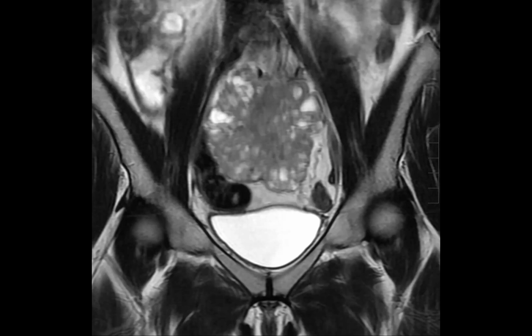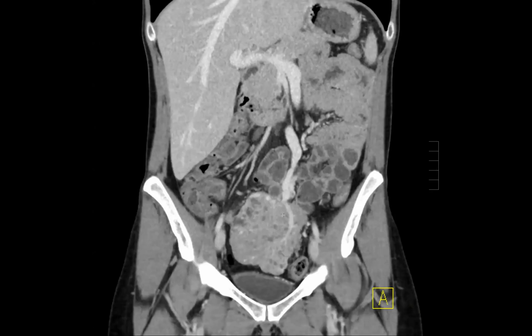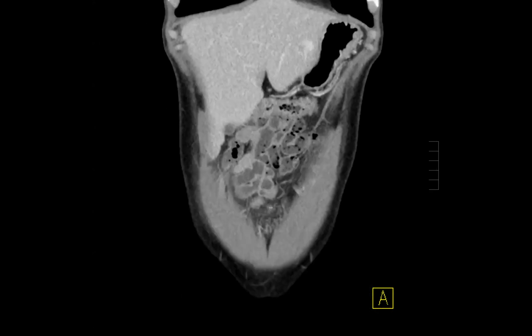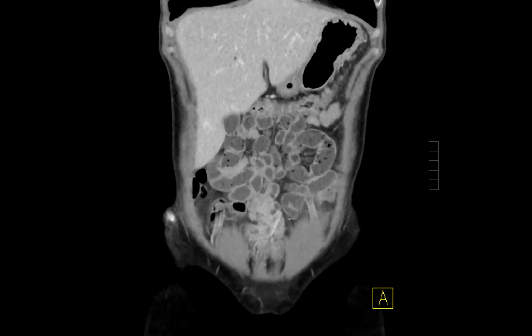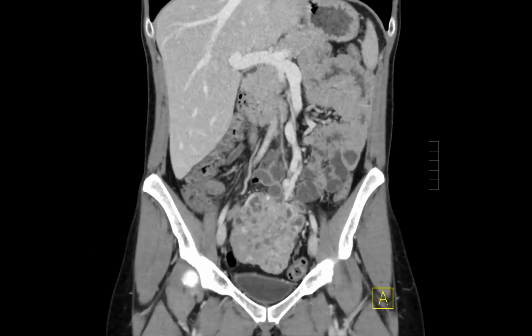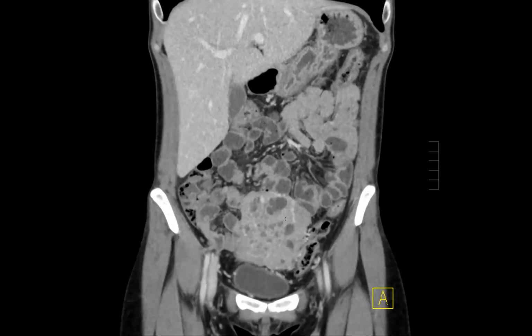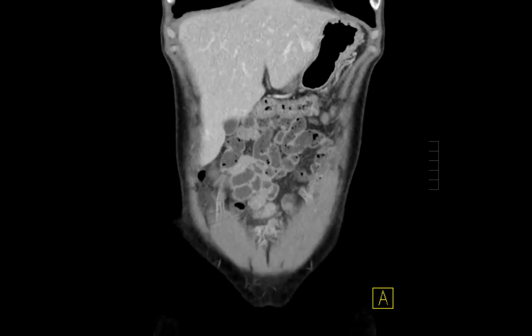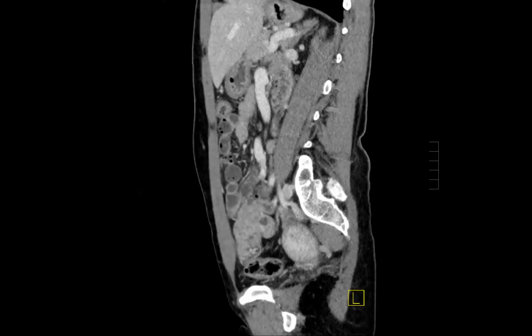Oh, I have CT, so let me show you. I think CT is helpful to clarify the anatomy. So the bowel is here, and it's separate from the mass, although it's touching some bowel loops. If it looked more like a GIST morphologically, then touching small bowel loops could mean that it arises from it. But I still think it looks weird for a GIST, so I'm thinking something along the lines of a mesenchymal tumor.